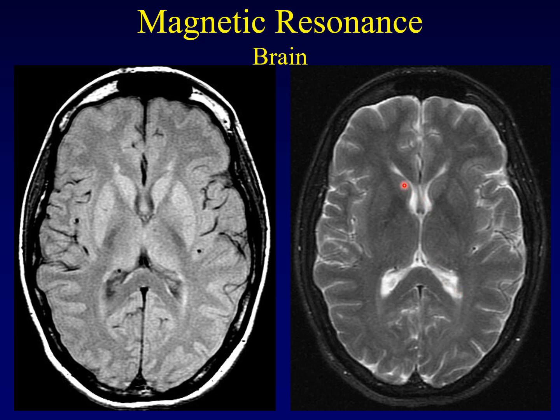You can see how well you can see the fluid, the CSF, both in the ventricles and surrounding sulci. We'll go into that anatomy later. You can see how well it shows on this T2 weighted sequence. But if you go to the proton density sequence, you can really make out the deep gray structures from the surrounding white matter. So there are advantages to both of these. And so we have a wide variety of different pulse sequences that we analyze on every single MRI of the brain.